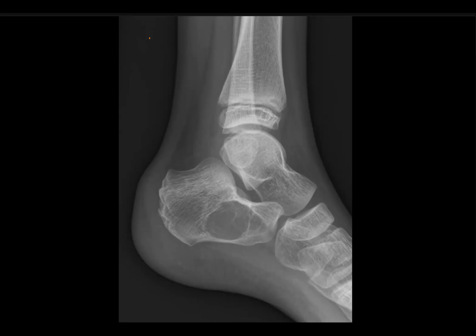This is a lateral ankle projection of a pediatric age group patient, in which I can appreciate that in the body of the calcaneum and in its anterior process, there is a very well defined expansile lesion with internal septations. There is a narrow zone of transition, no overlying periosteal reaction, and no internal chondroid calcification. There is no bone break. However, I would like to see it on the other view as well to confirm it. The underlying soft tissue is swollen, so the heel fat pad is swollen. It could be reactionary due to overlying inflammation.